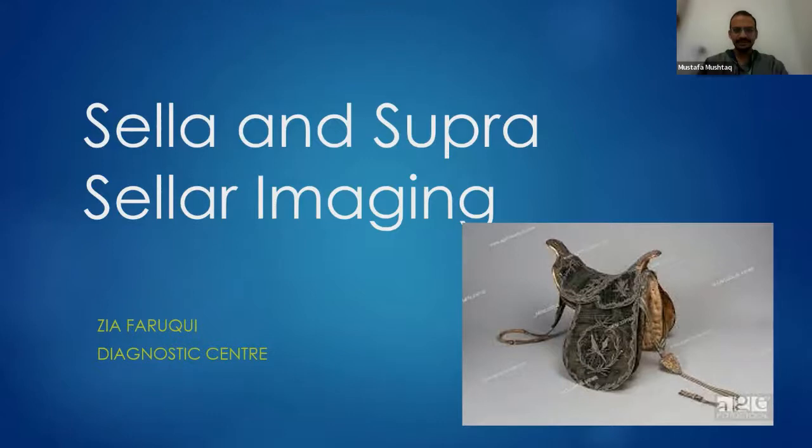So we're going to talk about sellar and suprasellar imaging. We're looking at the sella turcica, which basically means Turkish saddle. So there's a little Turkish saddle here, very fancy. As you can see, it's got high ends, which are the anterior and the posterior processes, and the pituitary fossa, which corresponds to where the rider sits.